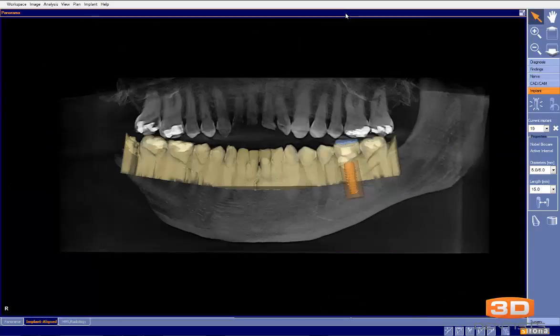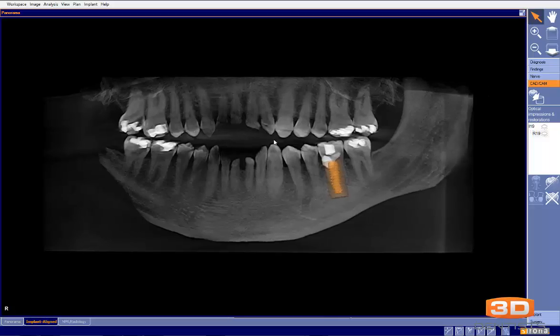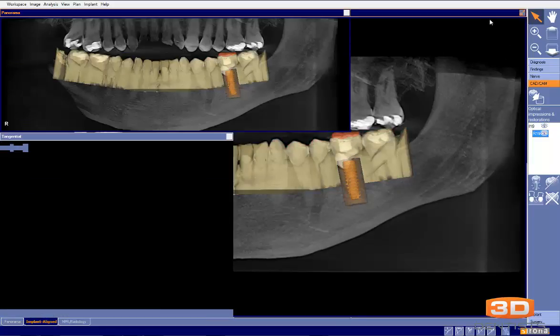Okay, we've been submitted a case here today to evaluate for immediate placement and the quality of the plan. Again, first thing, this is a great OptiGuide case. How much CEREC data do we have? More than enough to get an OptiGuide, and we have a tooth design there.